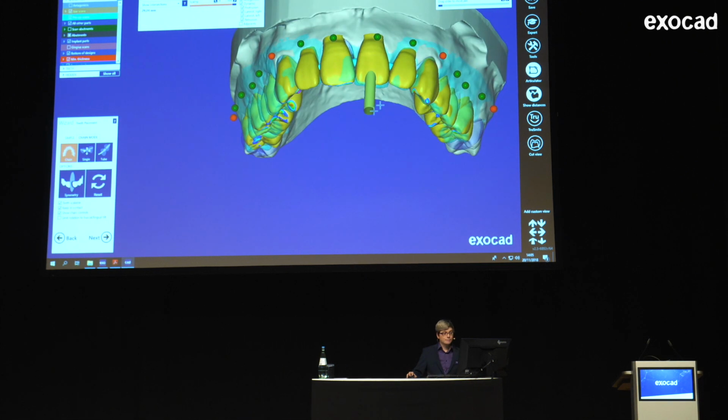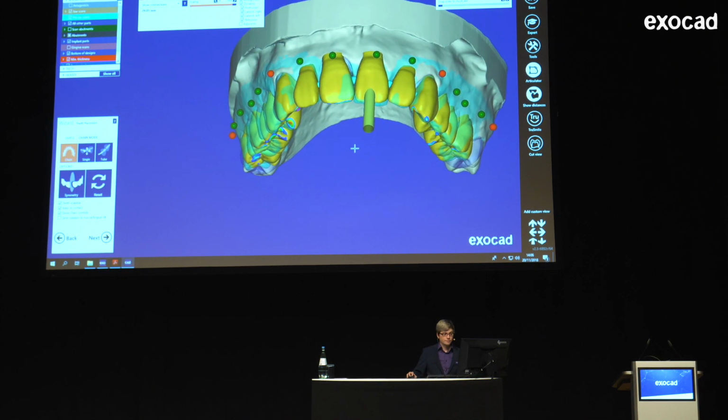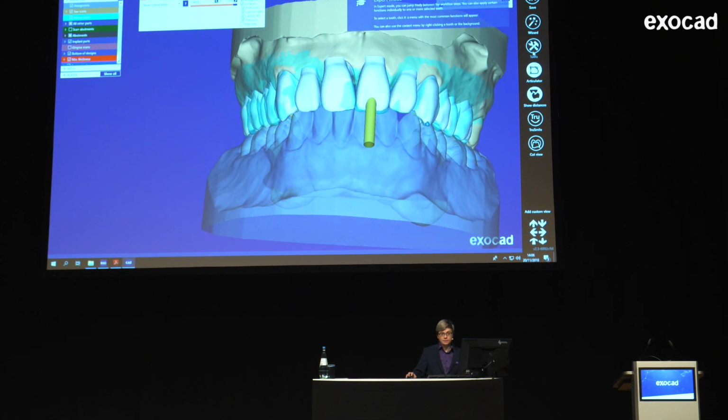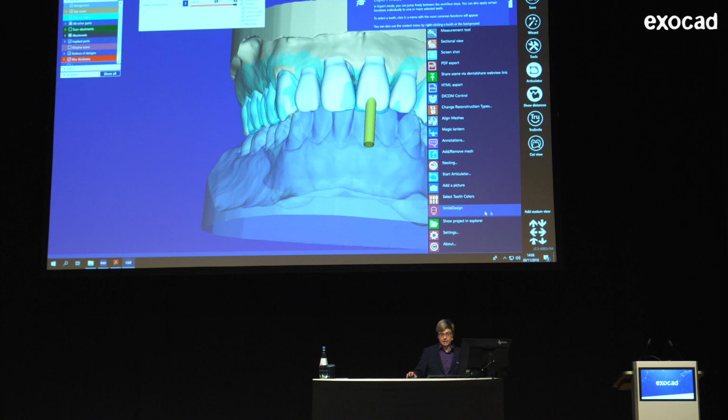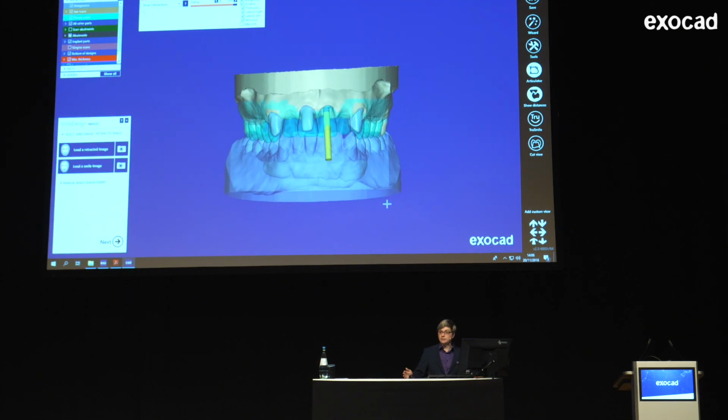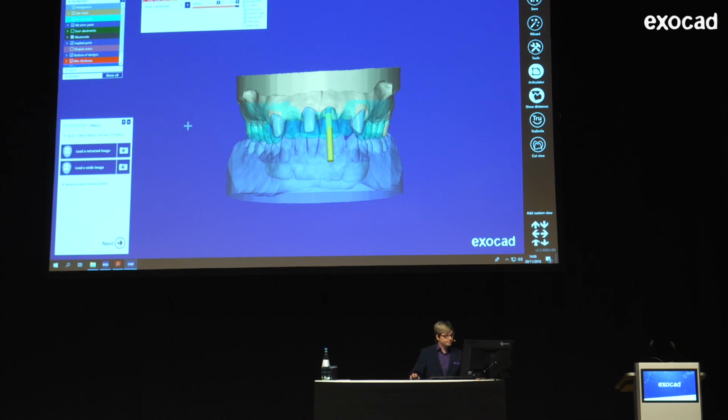But for this, I'm going to switch to the Smile Creator now. And I'm just switching to expert mode first. And in Tools, I can actually select it at any point in time, as I told you. And now the Smile Creator starts. It's its own little wizard with all the steps guiding you through the process of doing that.